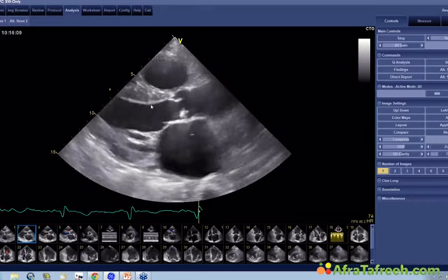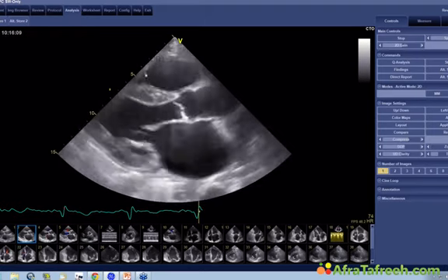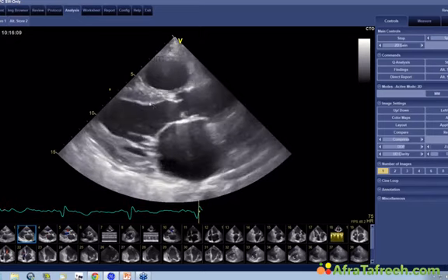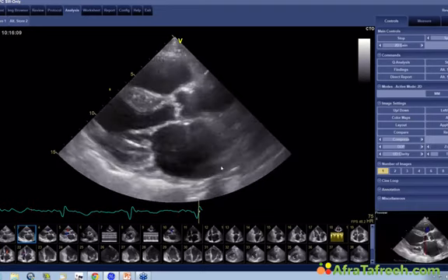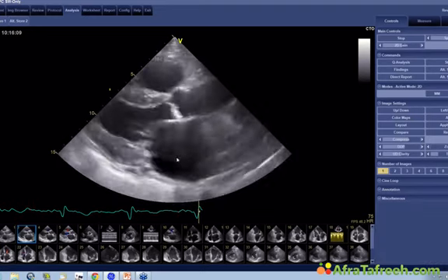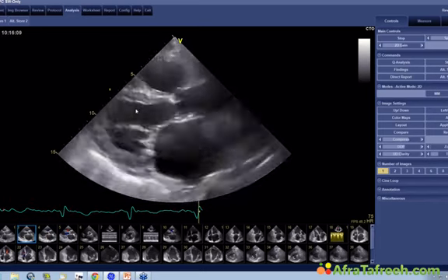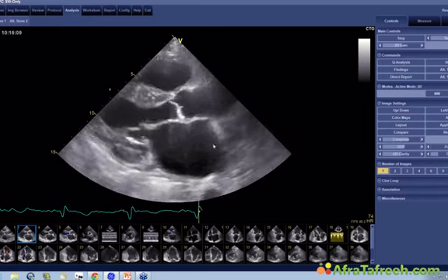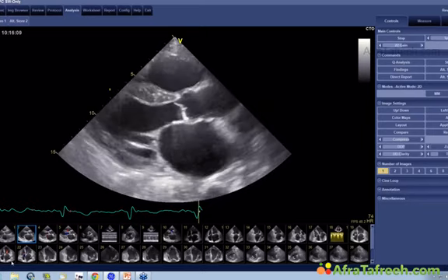Sure, I cannot say if this is regional or global, but even large infarcts, anterior infarcts, can be visible here in this parasternal long axis view, because very frequently you would even see the mid and basal portions of the septum having a wall motion abnormality. So in this view, my first thought is this must be some form of reduced left ventricular function, cardiomyopathy, with left ventricular hypertrophy and with an enlarged atrium, obviously also with aortic valve sclerosis, but probably no significant problem on the aortic valve.